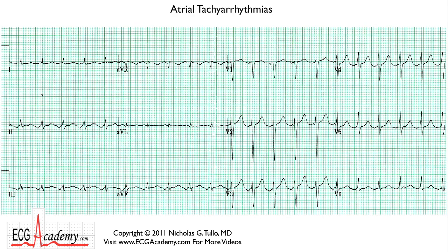Here's one example of supraventricular tachycardia, and this would be a patient who maybe walked into the emergency room with palpitations or lightheadedness. This is a 12 lead, and when you scan across, you can see that the QRS complexes appear to be quite regular. If you look for a QRS that lands on a solid line, you can count off 300, 150. It's about maybe 120 something. But remember the trick, look for two QRS complexes and count off that. So here's one and here's another. And those are exactly, let's see, 300, 150, 100, 75, 60.